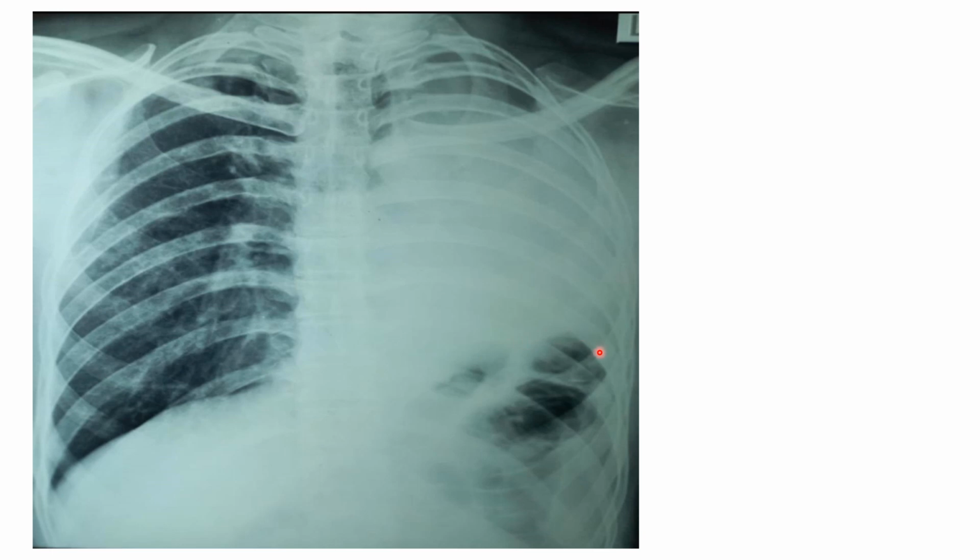So this diaphragm is elevated, and then you see the trachea is on the left side, and then it divides into the right main bronchus and the left main bronchus, and you see the stump of the left main bronchus. Just see the shadows coming up and dividing into two, and then here it abruptly ends. I'll tell you the diagnosis. This is a case of pneumonectomy. So they had removed the entire lung.